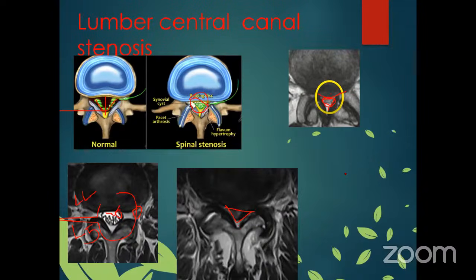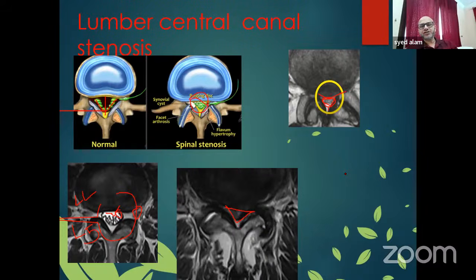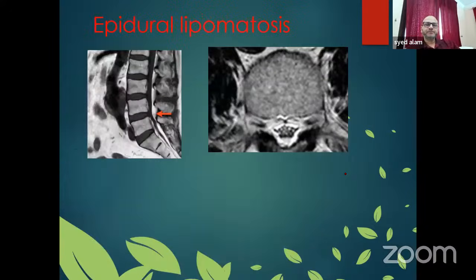Go ahead, please. So central canal stenosis, the definition has changed. We have to look for the CSF within the thecal sac. And sometimes there is some fat hypertrophy, which we call epidural lipomatosis, that can also cause central canal stenosis.